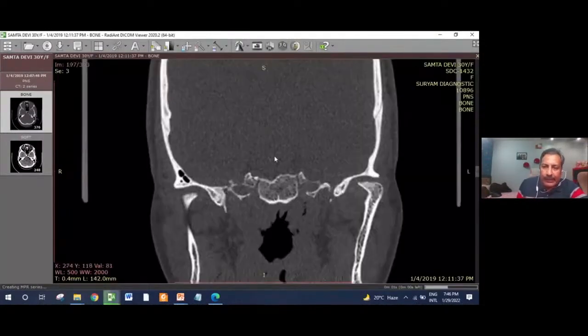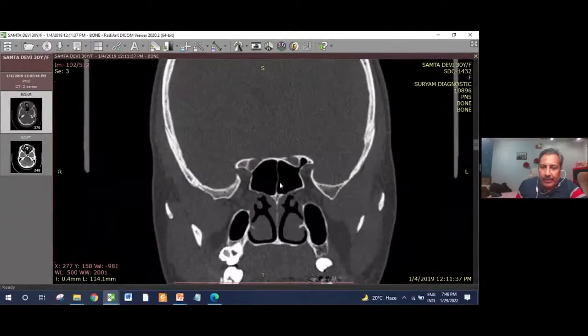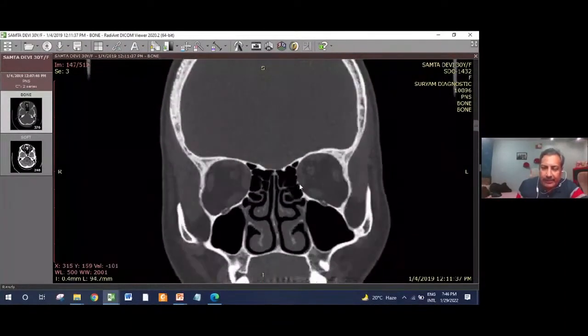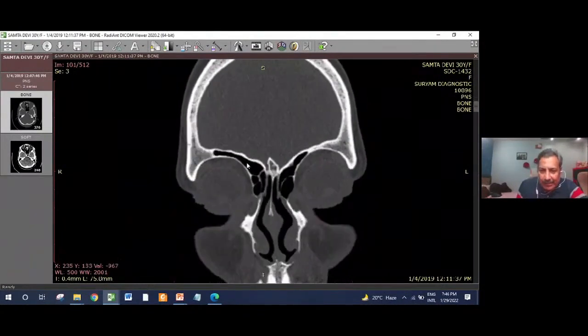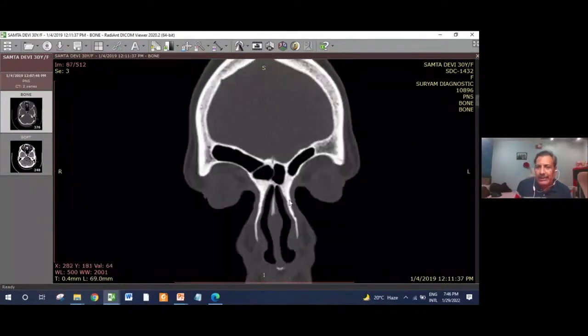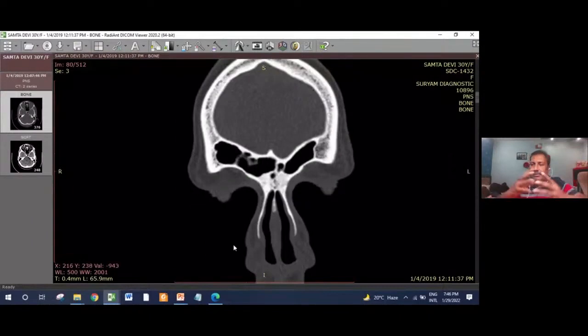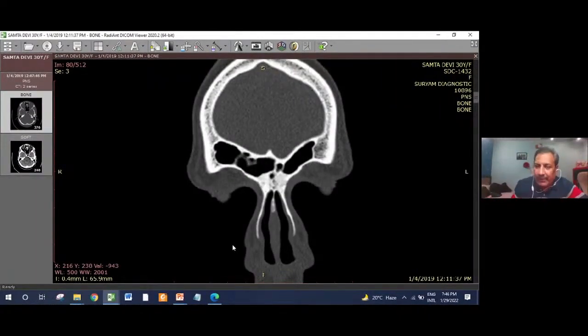Again, I am coming to the same picture now. How to read the CT scan right at the level of the frontal sinus. See this? That's the frontal sinus, frontal recess. This was the supraorbital cell. So I can give you one more clue whether it is a frontal sinus or supraorbital, because sometimes this cell is even bigger than the frontal sinus.